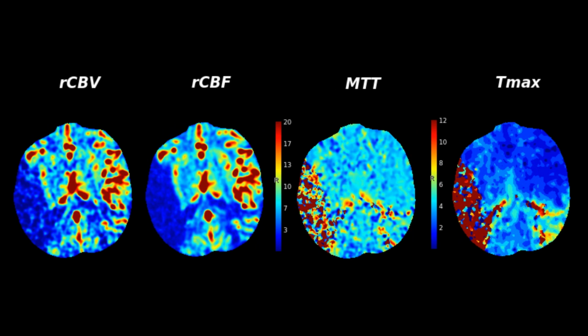The second example is also of a patient with a right MCA occlusion. Here, however, the CBF and Tmax maps both show matching large areas of abnormality in the right MCA vascular territory. This means that there is a large infarct with minimal, if any, surrounding penumbra. As there is little salvageable tissue, this patient would not be a good candidate for thrombectomy. CT perfusion can thus play a role in the decision-making process for determining which patients will benefit from a neurointervention.